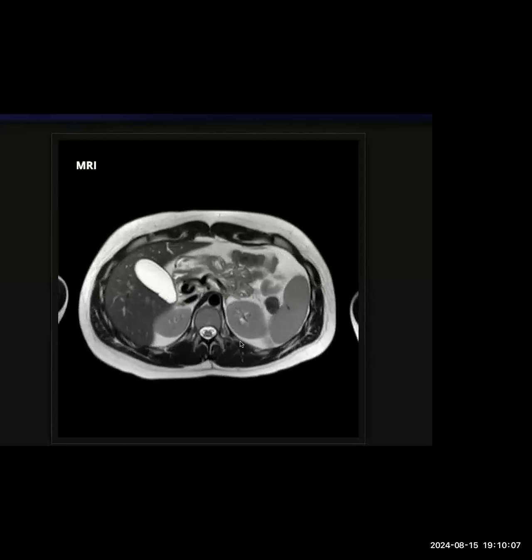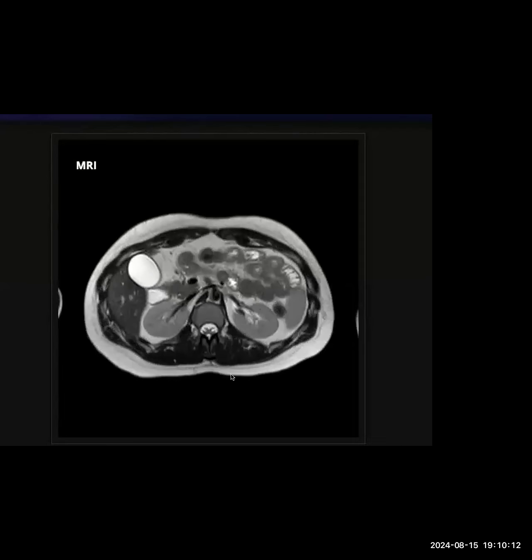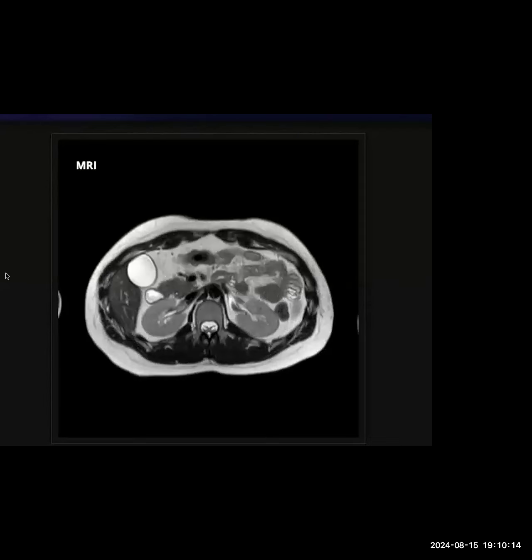So I don't think there is any issue. That is fine. Absolutely fine. Any annular pancreas? That's fine. Your time is up. It's fine. Thanks. Yeah, your time is up.